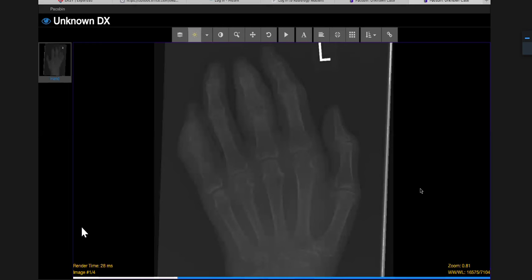These are multiple bony lesions in the proximal phalanges with a soft tissue component, and they have a lytic pattern to them. They're not expansile to the bone, but maybe this one is. So I wonder if this is gout. Other thing that I'm thinking about is psoriasis. I would like to correlate it with any history.